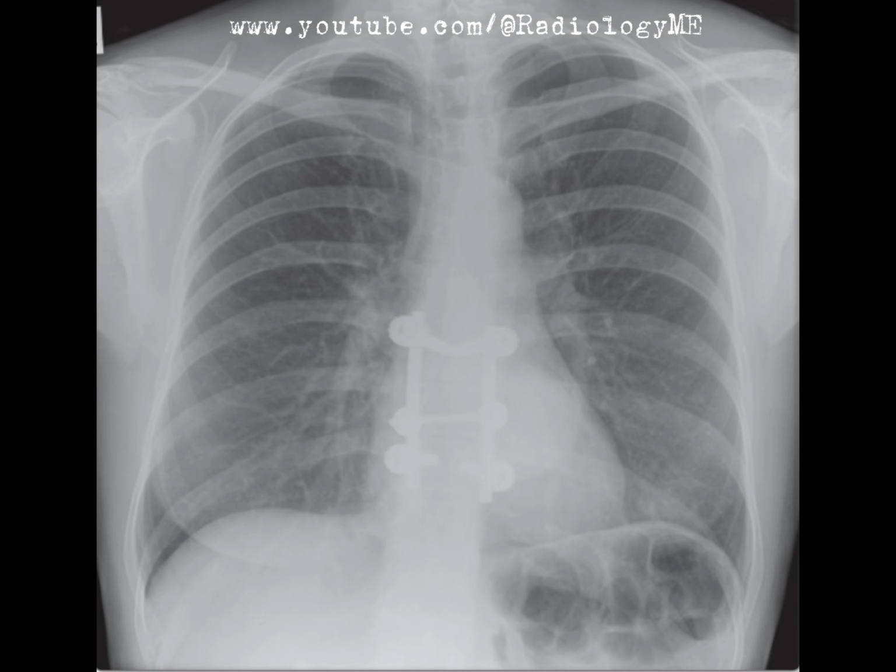Lastly, I'd expect the examiner to ask about other imaging modalities. I'd mention that while MRI gives us great soft tissue detail, CT could be helpful to assess any bony involvement more clearly, especially in the context of previous surgery.